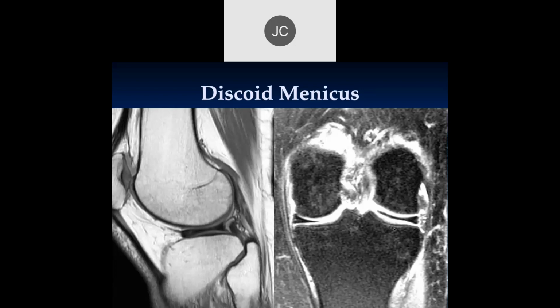Yeah. And when we do see these in adults, which we do fairly commonly because we see so many knees here, these can be asymptomatic, and you have to remember that because what you do, you look at the meniscus. If it's not torn, you look for other causes of symptoms, because if it's an asymptomatic discoid meniscus, it may not require surgical treatment. But if that's the cause of the symptoms, then that needs to be addressed.